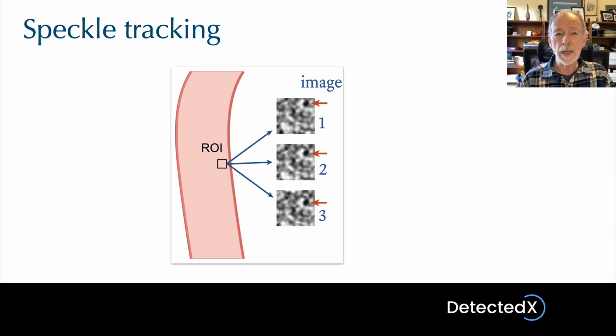The machine can automatically track this motion, so it can calculate the speed and direction of movement of that tissue, and therefore it is doing something similar to Doppler. The big difference, though, is that this is a two-dimensional measurement of motion. So we're no longer looking at just the movement parallel to the beam, as we are with Doppler. We're now looking at the movement in two dimensions, so we get both the speed and direction of motion from the ultrasound information. So this then enables a couple of different applications, which I'm going to go on now to describe.